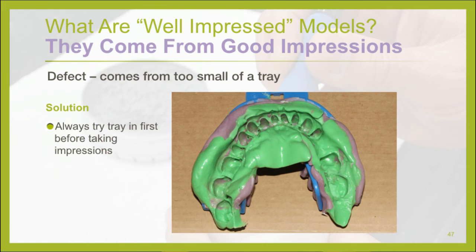And then the last one, which is a no-brainer. This one should be so easy for you to know why it's bad. These teeth cannot hang off of an impression tray. You say, oh, it's okay, it's the impression and we got all the detail. But the tray stabilizes the material. It makes it hard for the lab to be able to pour this up. And what if we have to articulate this model? What if we're prepping a full arch? They need to see that, but the tray is too small. The tray has to fit and support the material that captures all the landmarks. And so this tray is too small. It's got to fit the patient's mouth.